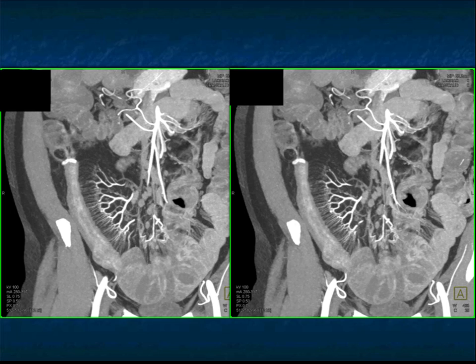And again, what you see very nicely in this example, same patient, is the mucosal enhancement. That's a really good sign of active disease. The lack of folds in the small bowel is a common finding with inflammatory changes, but especially common in Crohn's disease.